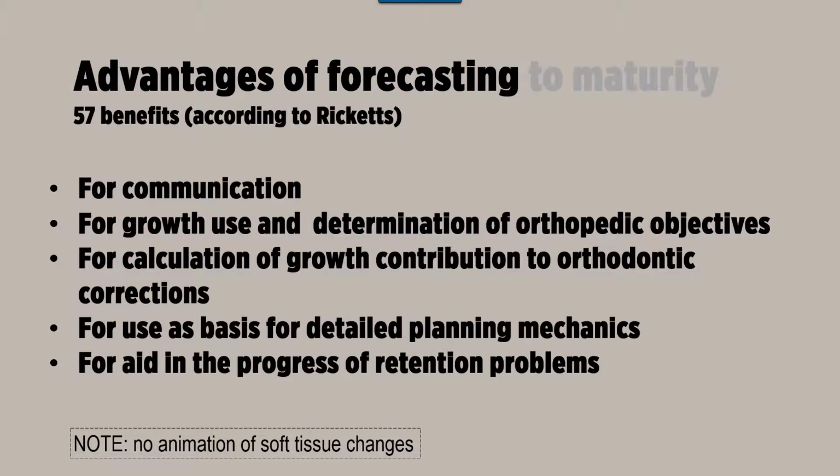Showing the simulation from images can be tricky or misleading when patient growth is predicted as well, because movements of bone structures are really big. I will later show how big they may be. And kids change a lot during their growth. So do not take a photo of an 8-year-old child and expect the software to create a 15-year-old kid out of it. It cannot be done.